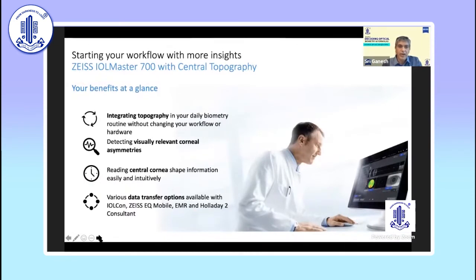So you don't have to do topography with another topographer, especially for your premium IOLs and your toric IOLs, or even your regular biometry, and you can detect any visually relevant corneal asymmetries. And you can also get the central corneal shape information very easily.